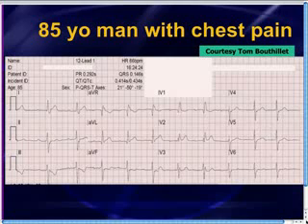He was an 85-year-old man who presented to the emergency department, or actually called 911 for chest pain, and this was the 12-lead EKG that I'm not sure whether either he or some of his colleagues obtained. You see that there's some wide complexes and maybe the rhythm's a little off, and so there's a handful of things that we're going to talk about.